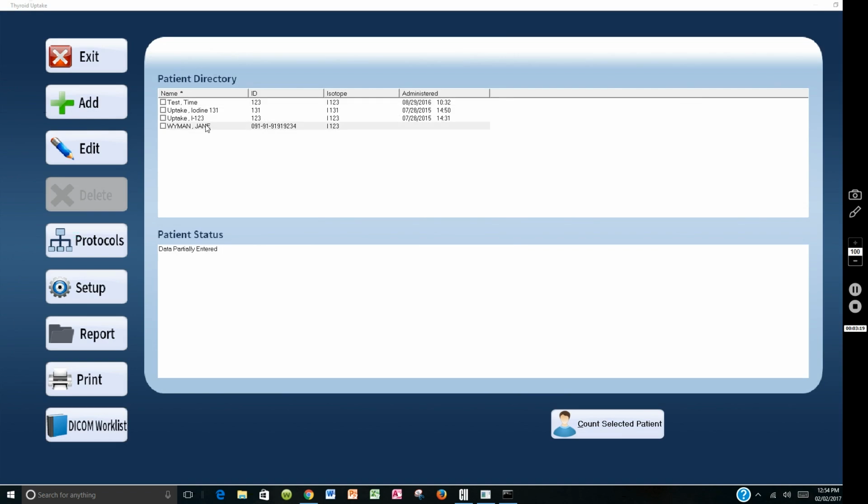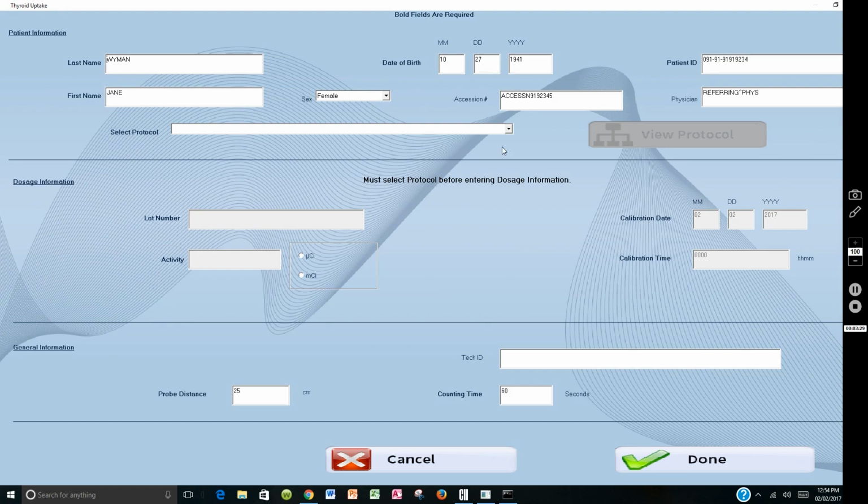We want to select Jane Wyman. So once we've selected the patient, it's going to come back and say there's additional information needed for this patient that you've just pulled over. So you say yes, want to update it. So you have to select the protocol. In this case, we'll say I-123 uptake.